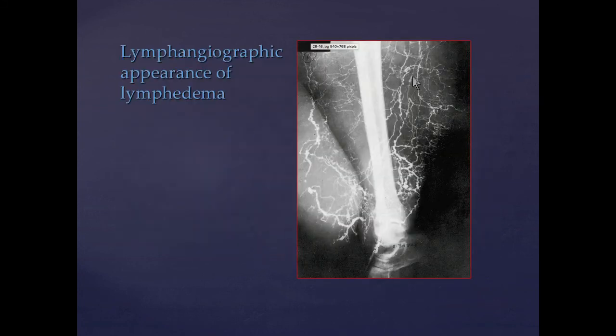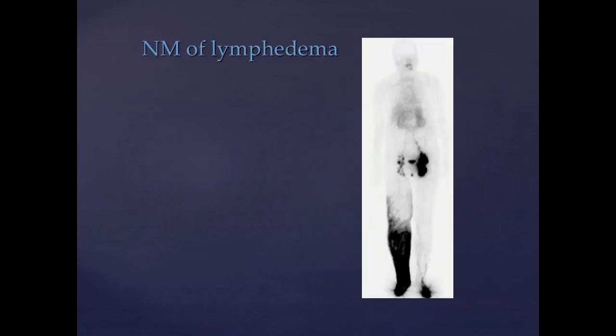Way back, occasionally we would do a lymphangiogram for lymphedema. It's progressed to stage 4. It's all rock hard. You can't really sort it out clinically, although you certainly have a strong suspicion. And here's that lacy network of lymphatics, and hold that picture in your mind because you're going to see that again in the depiction by MR. I borrowed this from the internet because the one case of this that I have is from like 1992, and I don't have the films anymore.